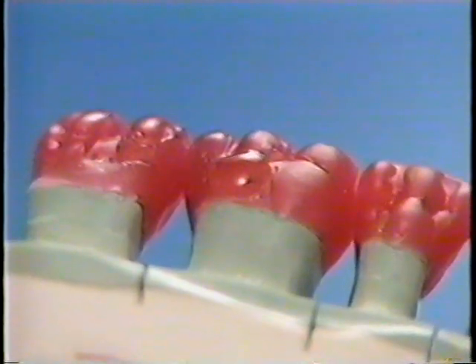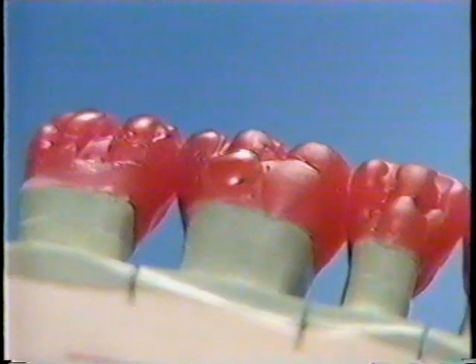Next, we'll build up the buccal cervical ridge following the contour guideline and the three-plane concept for modeling crowns. Although the build-up from the roots to the cusps need to be considered, the ridge height represents the most prominent portion of the crown on the buccal side. And once we've established the buccal center point, we've determined all necessary points of reference.